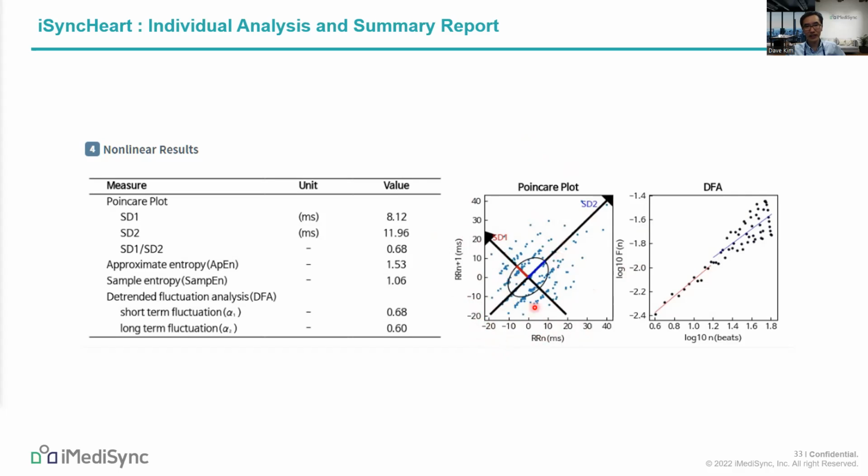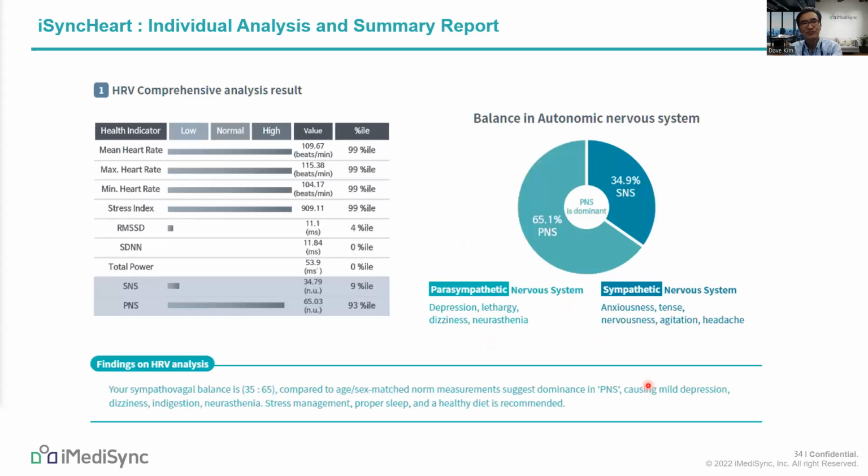This plot shows a very irregular pattern. This is a very regular pattern like this. Usually an irregular pattern is a healthy pattern. The widespread is a healthy pattern. This is a very particular example: very regular but very widespread.